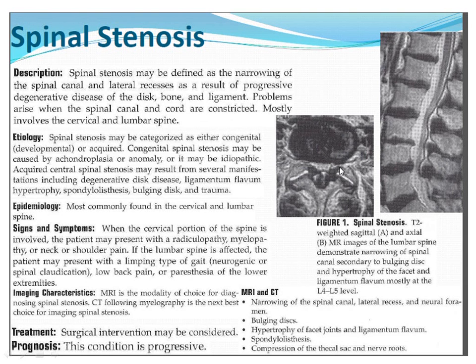These are the facet joints that I was talking about before. They can get a little bit hypertrophied. These ones are a little bit big here, and that causes narrowing centrally. And then this here is the ligamentum flavum that gets really thickened, and all of these three things contribute to it. And you can imagine if the patient had any spondylolisthesis at that level, that it would be extremely narrow. Already this one is at least moderately narrowed, so this patient would be having some pretty significant symptoms.